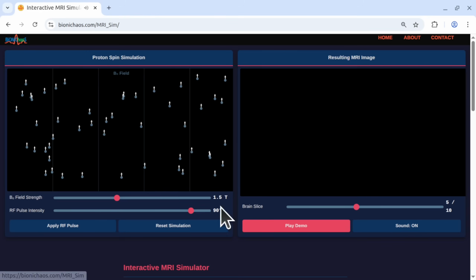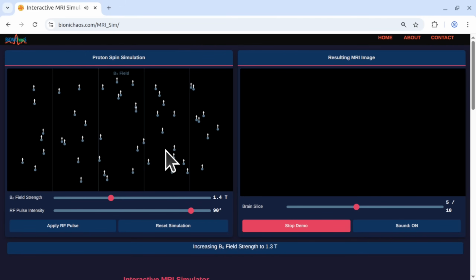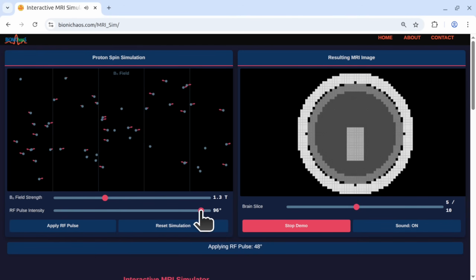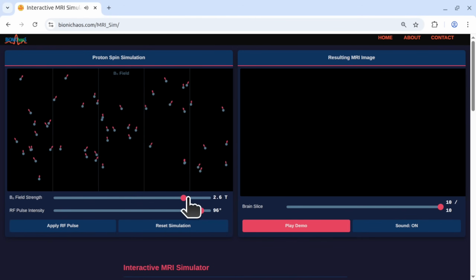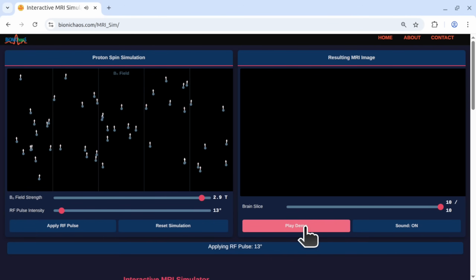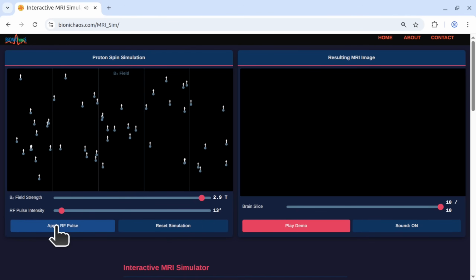And the last one is the one the robot was talking about before. You can choose your strength of the magnetic field. Adjust your, well, that's still in demo mode. So you can do it.